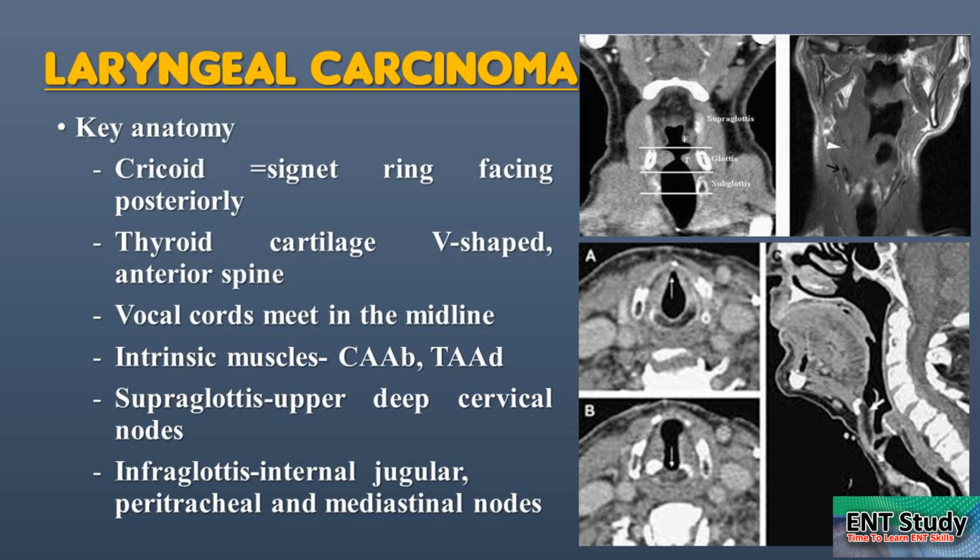the cricoid sits basically inside the thyroid. Okay. Thyroid cartilages are V-shaped with their spine anteriorly and their open face posteriorly. It's an inverted V. So you have to look at the thyroid cartilage, blackish areas, intact lines, they should be there. Then glottis, vocal cords should be symmetrical.